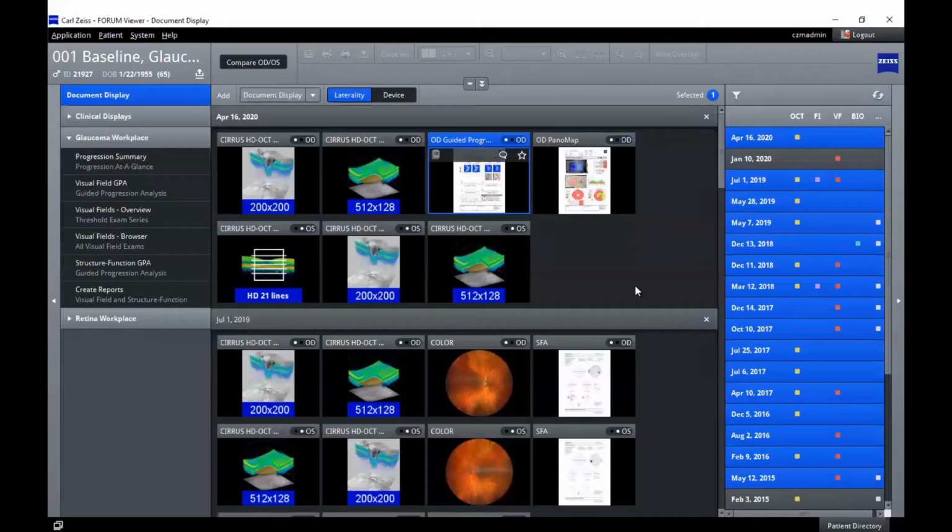What a great case, highlighting sort of the robustness of the technology, the capabilities that we have. And sometimes that can be a bit overwhelming. Right? And so we've got to take these times to look at it and digest and think about what's on the screen that's in front of us. Any opportunity, though, that we have to understand the why or how we got to where the data is can be useful. But to start with, what I thought I'd show to those in attendance today is just a little bit inside of Forum, both the capability to do things the way we've always done them, as well as to merge that with maybe new ways to attack the problem.